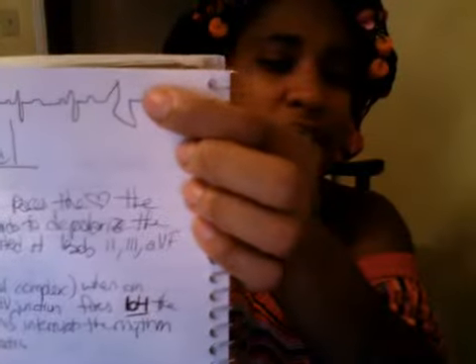So this is a PVC. If you have a PVC beat, which they wouldn't call a PVC beat, they call it the idioventricular rhythm. Oh God, the pen would die right now. It kind of looks like that. I know it's really funky. There's no narrow QRS, but that's the way you're going to tell the difference between your junctional and your idioventricular.